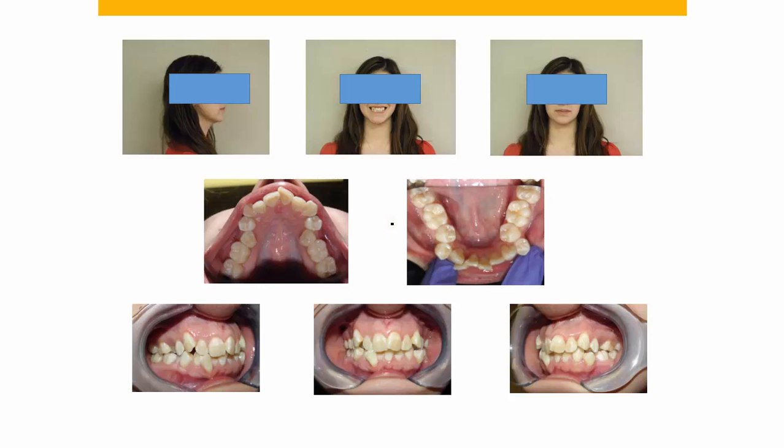If you take a look at this case, I picked this case because I think for most orthodontists this will be a first bicuspid extraction case, all four first bicuspids. I know there are some outliers out there that would consider doing this case non-extraction, but for most of us orthodontists, extractions would be indicated in this case. At least I believe that would be the case.